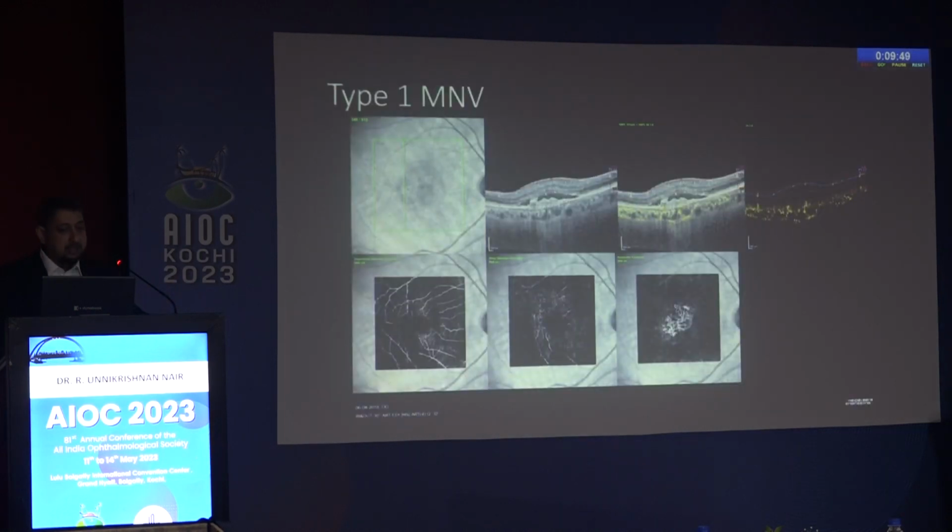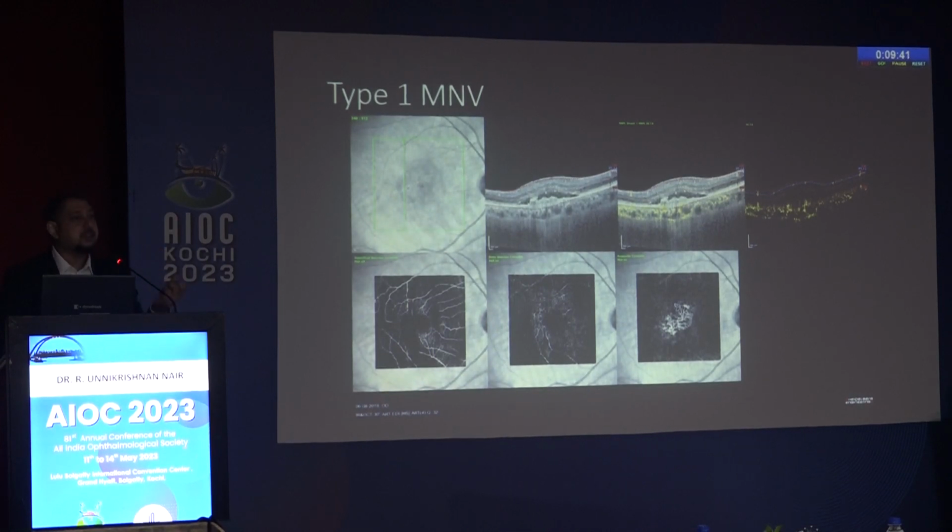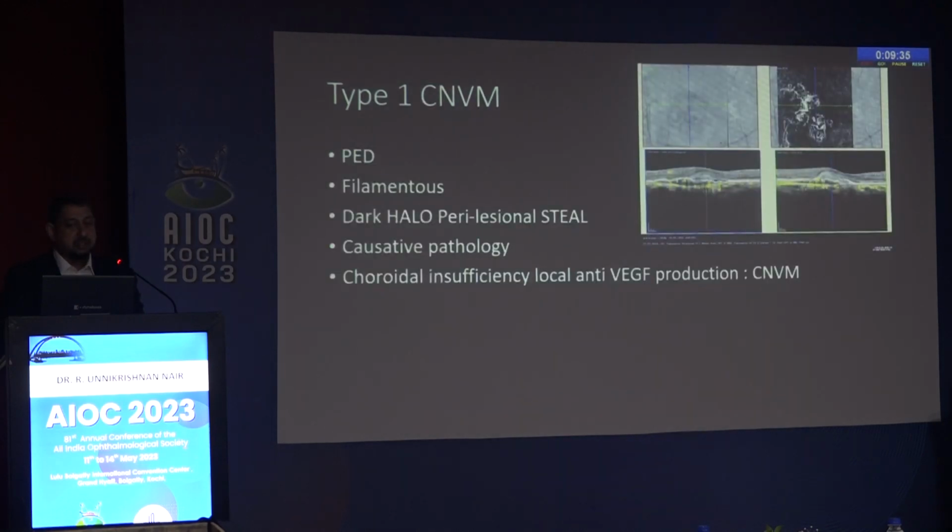So the type 1 lesions are very different from what we saw. You can see immediately from the picture that the fine, fibrillary nature is lost. Fibrillary becomes filamentous. You see larger vessels, more defined, more gaps between the vessels. This is a very beautiful picture of a type 1. Large vessels going in different directions, gaps between the vessels, and the very fineness of the constitution is lost because of this.